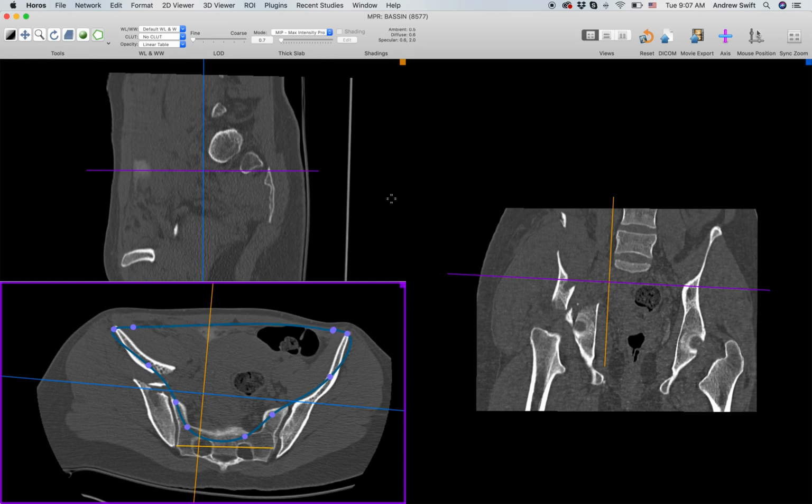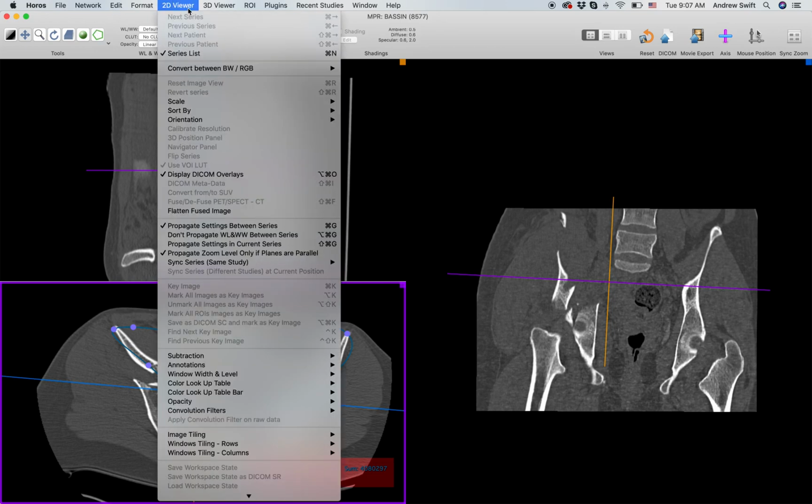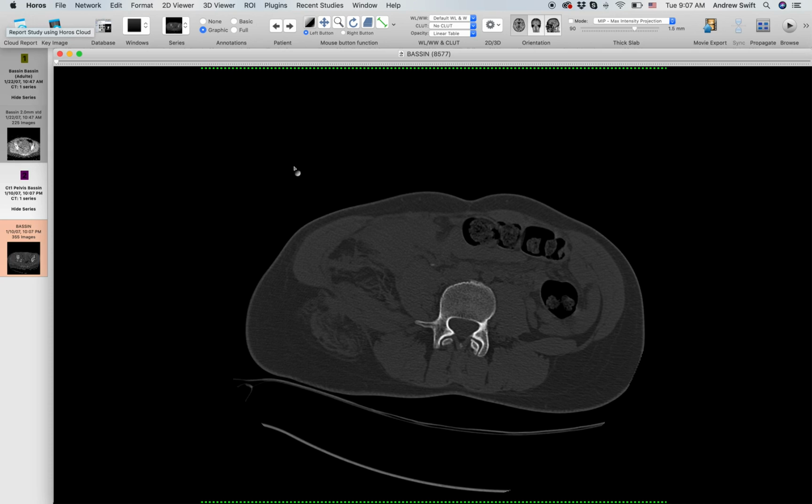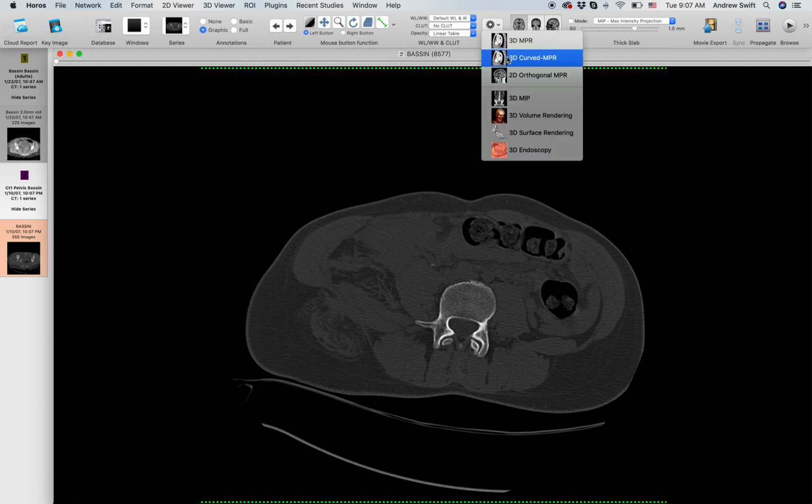And if we come back here, there's an area, and if we did it in multiple groups, it would show us the volume as well. Anyhow, and it tells us the length. Anyhow, this is how radiologists use this. Now, everything you do here is non-destructive, and you can always revert series if you change anything or you delete anything. We'll show you that. All right, let's look at some of these other things.